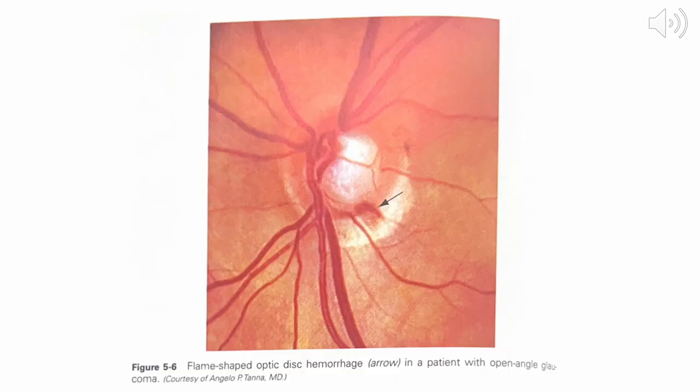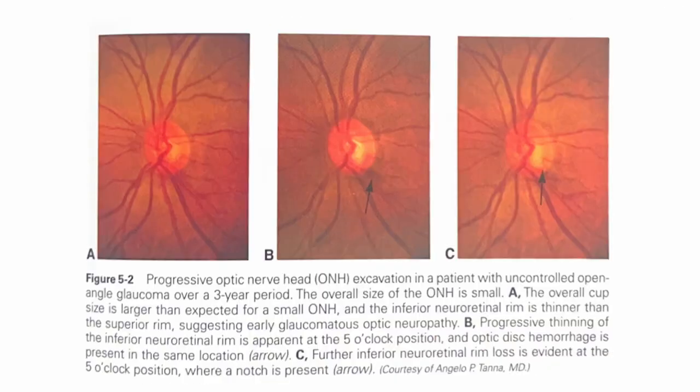This finding reinforces the message that disc hemorrhages often arise at structurally vulnerable points on the optic nerve. While subtle, their presence may be the only active indicator that the disease is progressing. This underscores the importance of meticulous optic nerve head evaluation at each visit, especially in patients who may otherwise appear stable. If missed, the opportunity to intervene early may be lost.